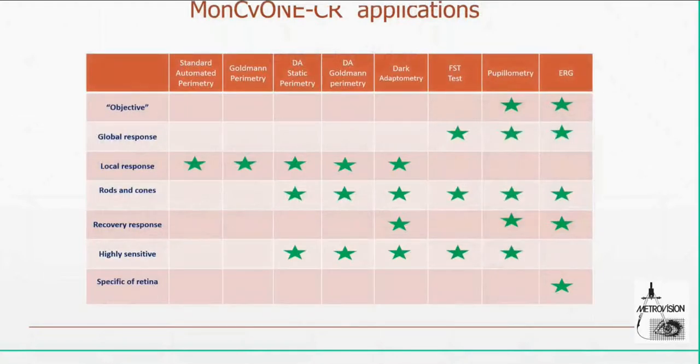So the applications, as you can see, are numerous. We have the possibility to do standard automated perimetry, Goldmann perimetry, dark adapted static perimetry, dark adapted Goldmann perimetry also, which is not so frequent on the existing equipment. Dark adaptometry, FST test, pupillometry, and electrophysiology.